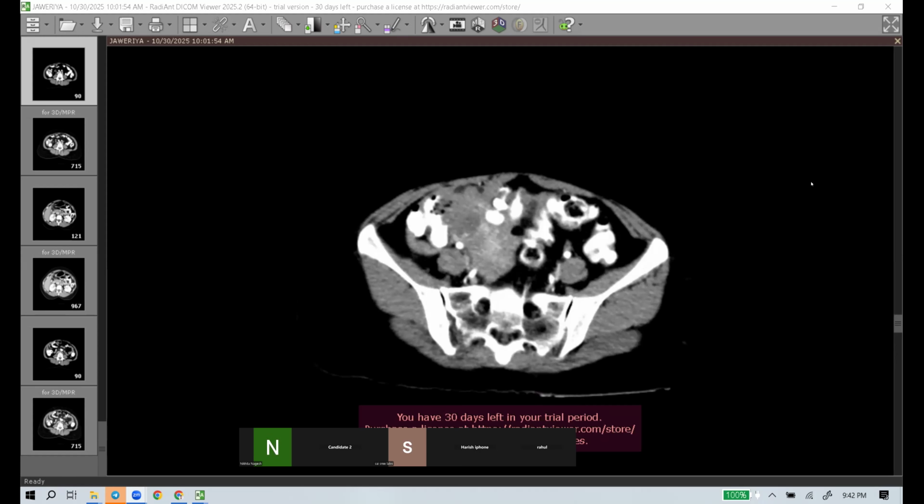Really? Just the differentials. There could be any malignancies, underlying ovarian malignancy with fluid. Okay. I'm not able to appreciate any calcification or anything within the lesion to say that it could be a dermoid cyst. Yeah. Okay.